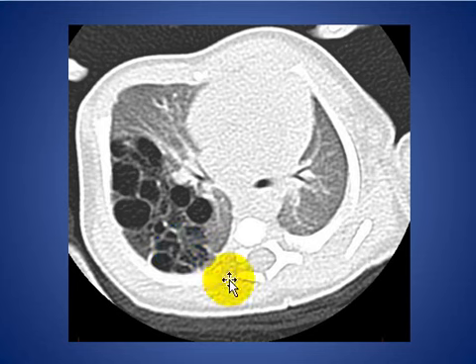and there are no apparent blood vessels going to a sequestration. So this is a classic example of congenital cystic adenomatoid malformation, or congenital pulmonary airway malformation, CPAM. This is the new terminology.